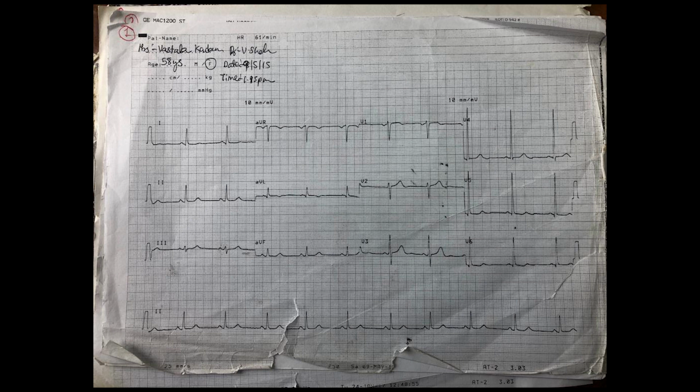So the axis will be perpendicular to lead 3. See the diagram, remember the diagram. Lead 3 is at plus 120, so the perpendicular is AVR. AVR is perpendicular to lead 3. AVR is predominantly negative, but remember AVR negative is plus 30 and AVR positive deflection is minus 150. See the diagram. So the axis is plus 30.